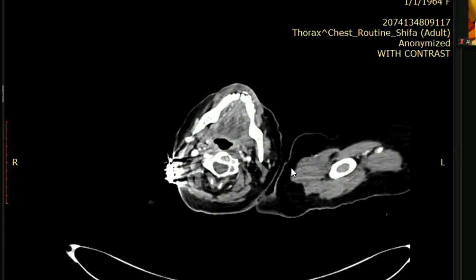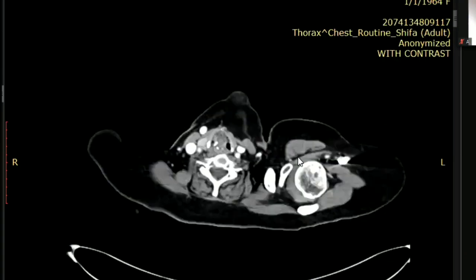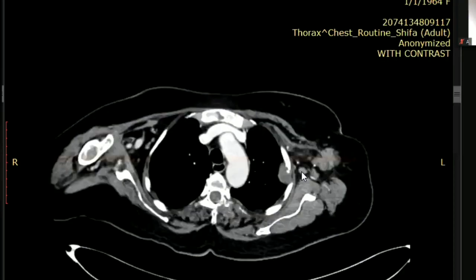You have told yourselves that you will look at one scapula, then the left scapula, right clavicle, then left clavicle, right shoulder, then left shoulder, right humerus, and it will be just a 1 second review. But because you are following a methodology, when you find anything different between right and left, you will be able to pick that up as a radiologist. But if you keep jumping from humerus to clavicle, clavicle to ribs, ribs to spine, then you can miss the findings, right? So now I will scroll the CT because this case has been discussed in detail.